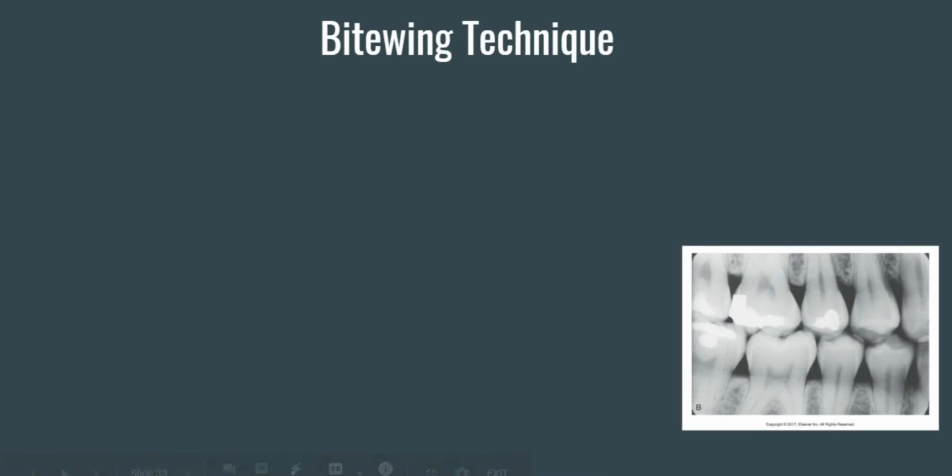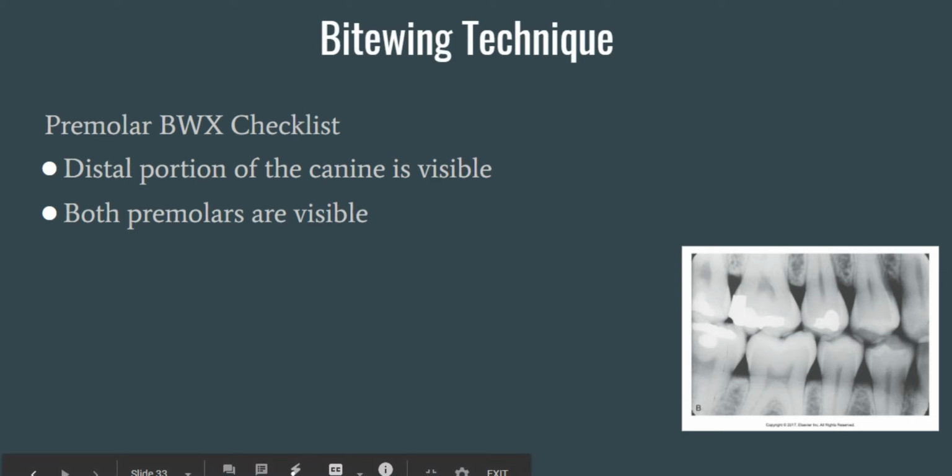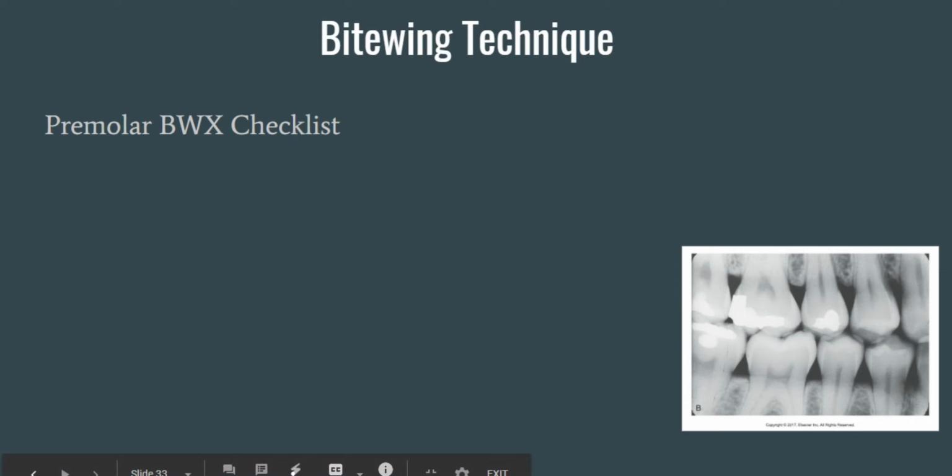Okay, I'm going to pick this one up. So let me back it up here a minute. I'm going to pick it up starting with the premolar checklist.